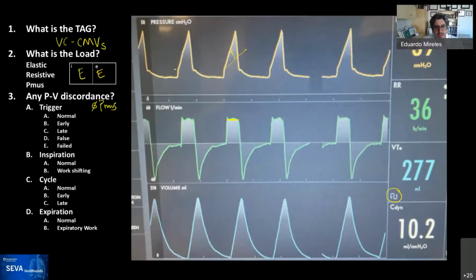And then you see the step up that occurs in terms of the resistive load. It's this little initial change in slope, you can see it very nicely there. This is the point where the initial resistive load occurs, and then it goes all the way to the top. So now you know how much of the resistive component exists.